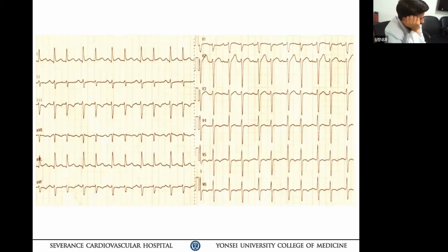So there's a P wave, and then followed by two QRSs, which have slightly different morphologies. So we have a P wave, a pair of QRS, another P wave, a pair of QRS. The amplitude is also slightly different. The second QRS in the pair does not have a P wave preceding it, and it doesn't seem to have a retrograde P wave either.